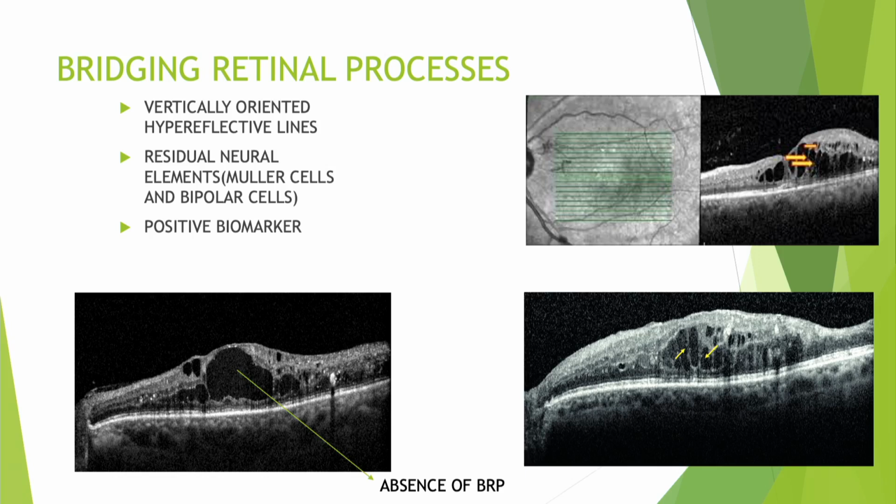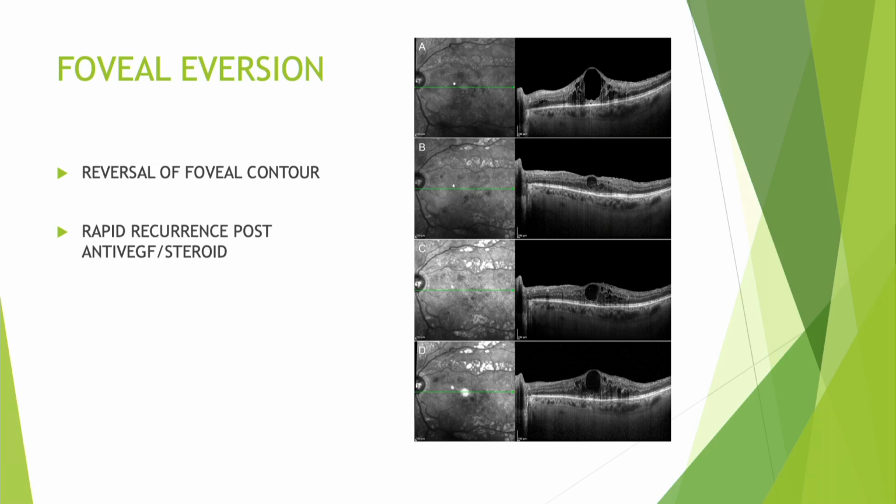Whenever you have these bridging retinal processes, it indicates a better visual response following therapy. An absence of bridging retinal processes usually indicates a poor prognosis even following therapy.